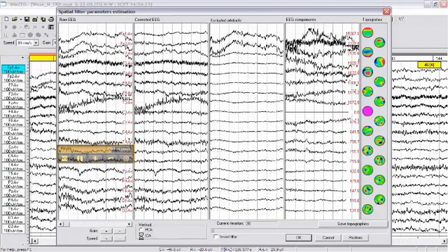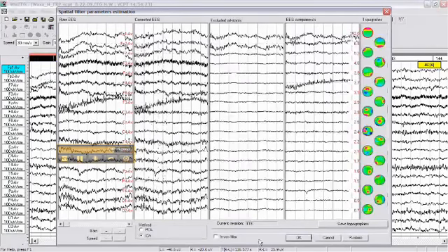It starts decomposing EEG into independent components. It takes time, and after approximately 100 iterations, it stops. So it finds the components. The topographies of the components are presented on the right of the window, and you select the component that corresponds to eye blinks as well as to horizontal eye movement.